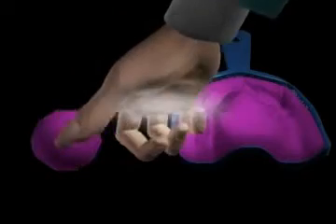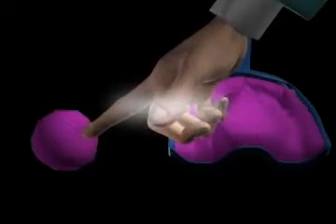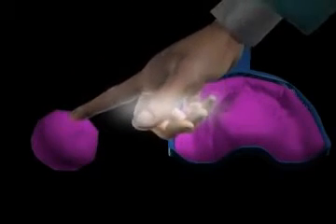The requirements for impression materials are good fluidity and moisture tolerance. When both conditions exist, it allows for exact borders of the replica structures. Exact borders are important in order to achieve an exact denture fit.